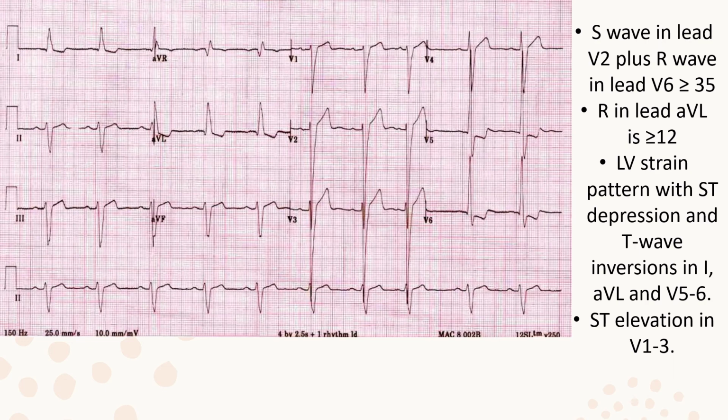For the most part, when we look at this EKG, I can clearly see that that QRS complex is wide. Is it greater than 0.11? So it's at least 0.12. Let's see, 5, 1, 2, 3, 4. It's about 0.16. It's pretty wide. So there's definitely a bundle branch block.